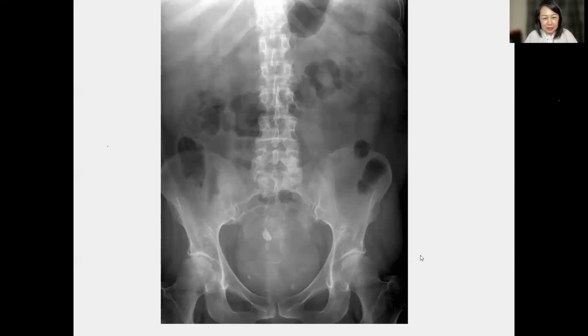Obstructed bowel? Bowel gas is quite good. You will see it's not dilated and just a little bit of fecal material. Normal bowel. Fibroid, no. Okay, I'll give you a differential: young female patient.